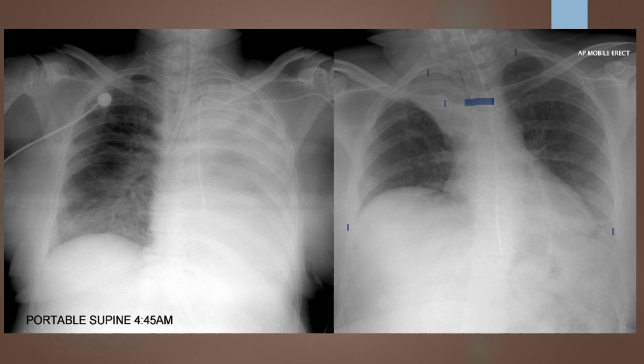Beyond that, I'm going to go ahead and continue my evaluation. I would typically look and see if my spinous processes, since I do have relatively good penetration here, are to my patient's left, which would support that the patient is in an RPO projection. So based off of this, I'd say this is repeatable. This is a really significant rotation.